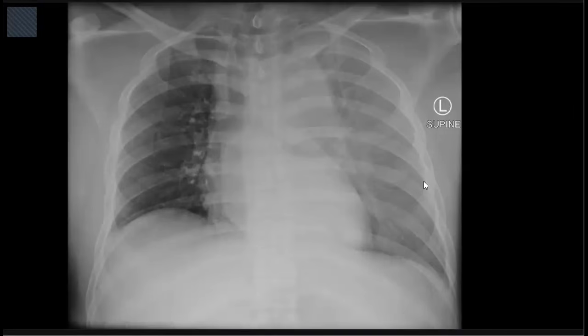Okay, what are you thinking about with this patient? So I'm thinking about aortic injury and complications like pulmonary contusions or aspirations and some complicated by left upper lobe collapse. Okay. So this is a serious emergency. I will ask the team for a CT aortogram to look for aortic injury.